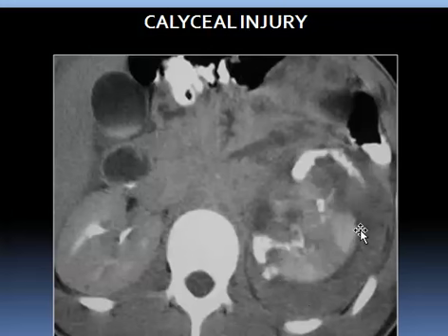fluid, urine, and this after a while collects under the left kidney, inferior to the left kidney, pushing the kidney up, and reaching down to the iliopsoas fascia and being enclosed within the Gerota fascia. It will be a big collection called urinoma, pushing the kidney up and reaching down into the pelvis. So by time it becomes chronic and it becomes fluid which could be infected.